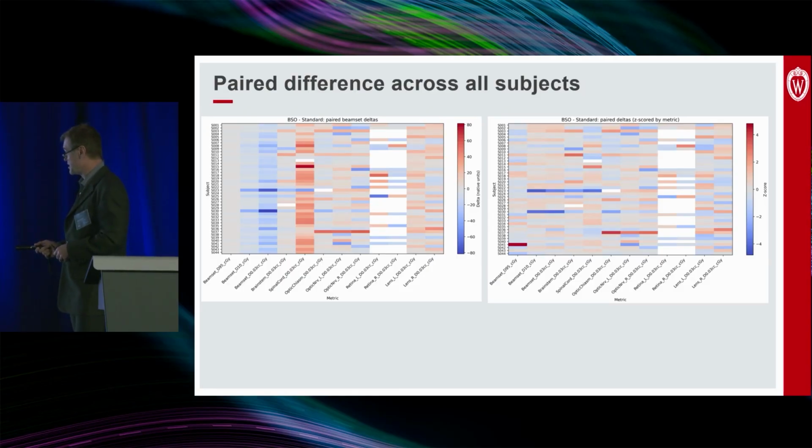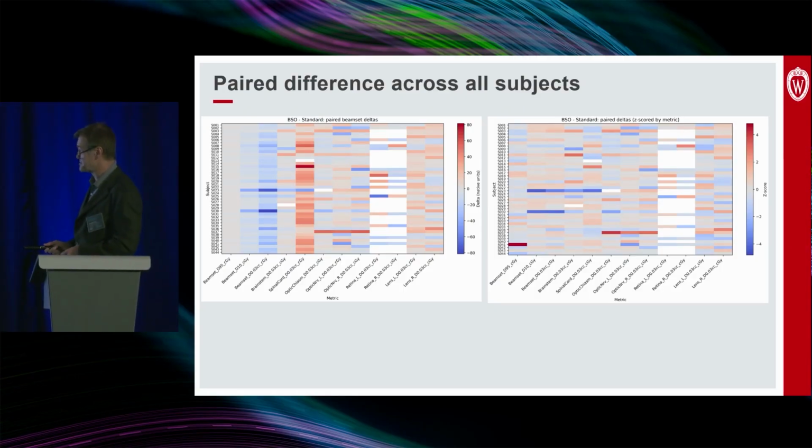And then you see your beam set D10, the beam set max dose, and we just kind of move through organs at risk here. The spinal cord probably is the one where there's the most variation. Again, this is showing you that the spinal cord in the beam-specific objectives is hotter than the single segment plan, and it's probably just due to some different weighting with the objectives and the objective function.